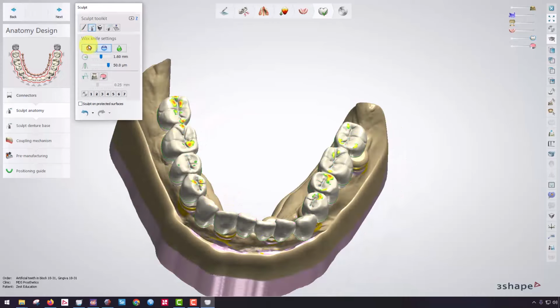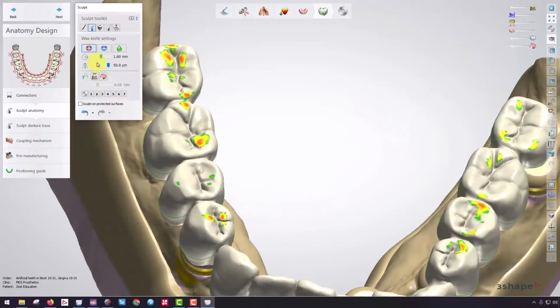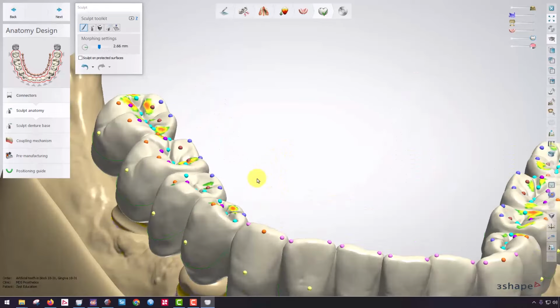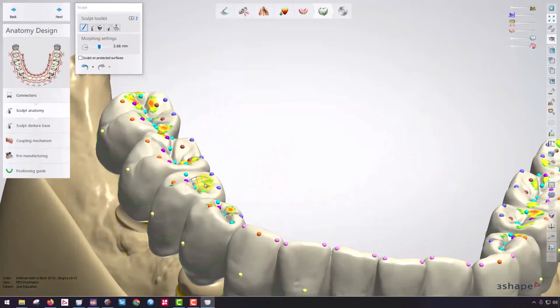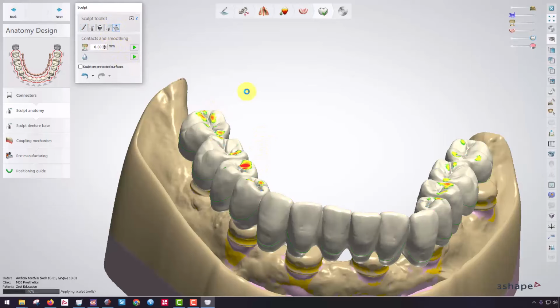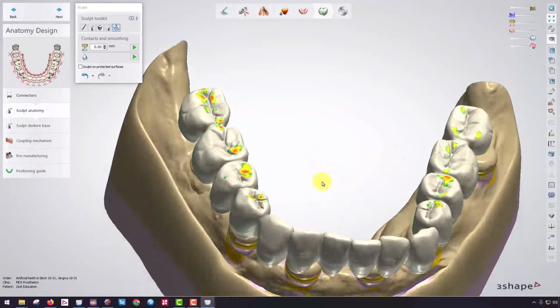If I want to add a little bit of a sculpt, and I know it's not the best way to do it with this tool, but that's okay, just because I find it really easy to use. There we go. And then grab one more little thing. There, that should fix it. Oop, too much. Let me go back to my joystick. 0. Make sure everything's even now. There we go.